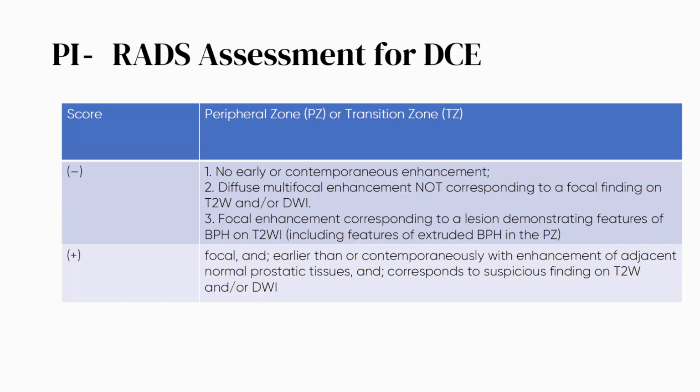Regarding the PIRADS assessment of the dynamic contrast enhancement, as we discussed in the last session, this is the curve features of the malignant lesion. This is a malignant lesion: focal, rapid, quick enhancement and rapid washout. This is the classic curve for the malignant focal lesion.